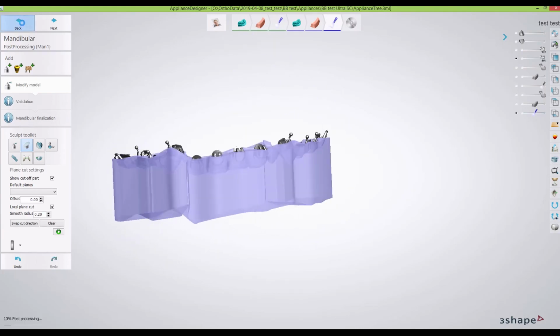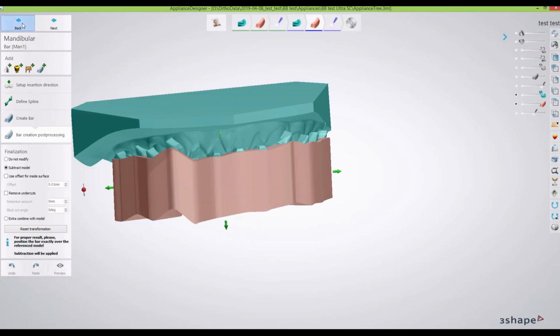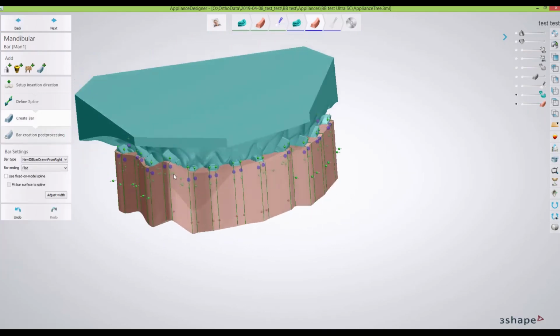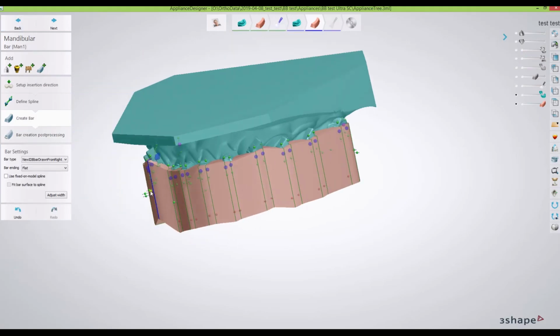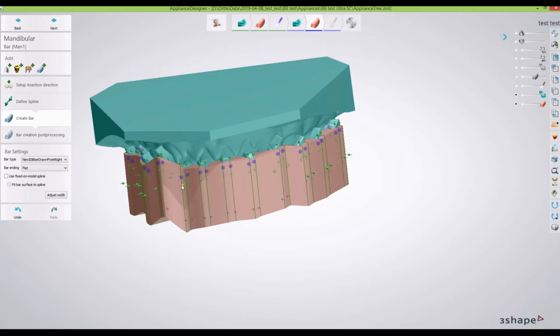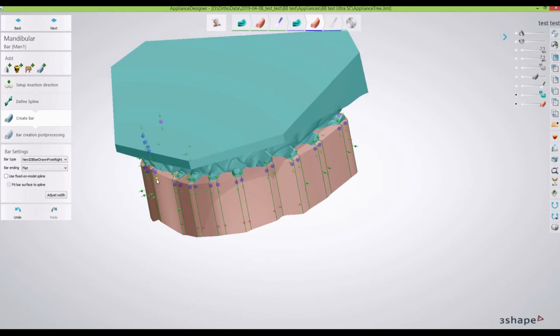So just go backward, and it's going to let us go back till this point here, and we're going to want to bulk that up a little bit. So I think I want to bring it out. Those are sometimes tricky to find the right point. If we can bring it.